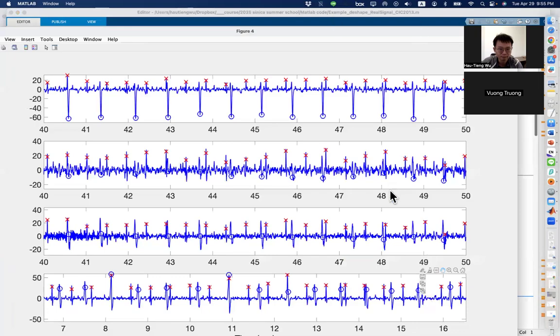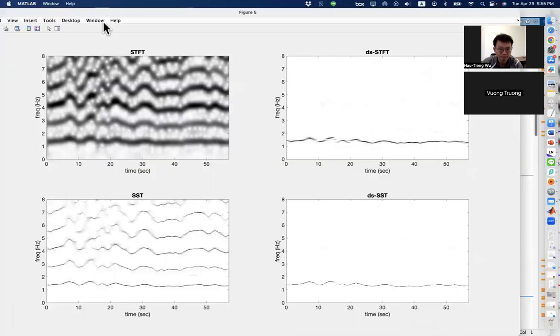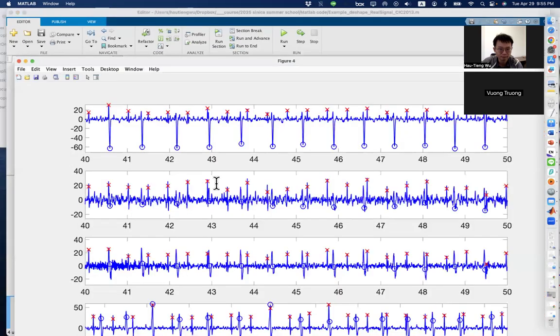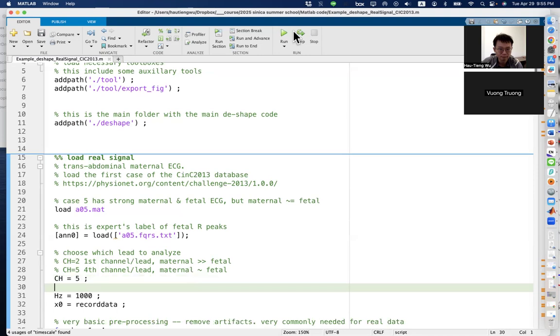Now let's see what you get from the Dshape. This time, you can see. Hey, hold on. This is weird. I have changed to, sorry, I forgot to change to 5. No wonder. Sorry, that is weird. Okay, so let me rerun it.